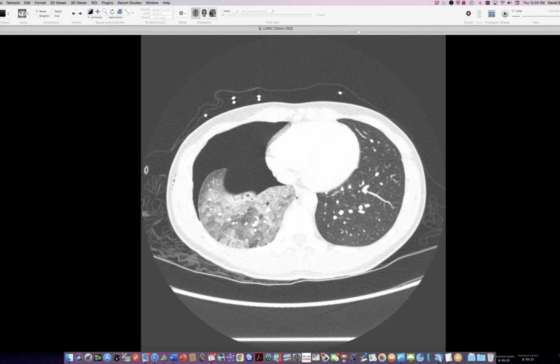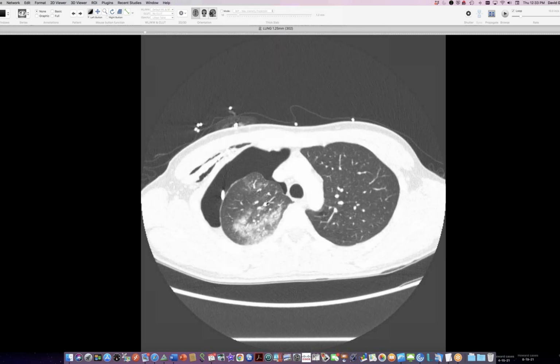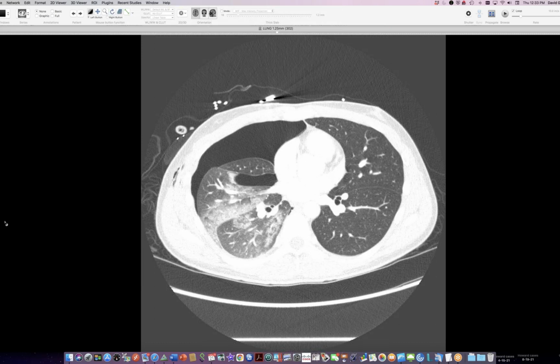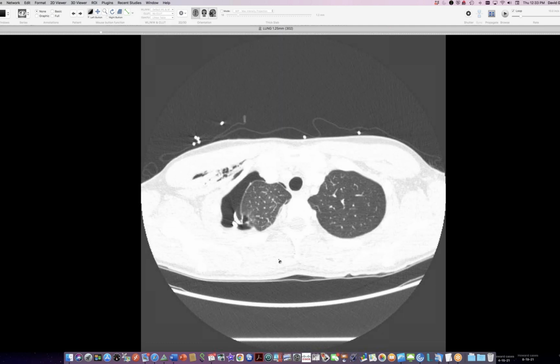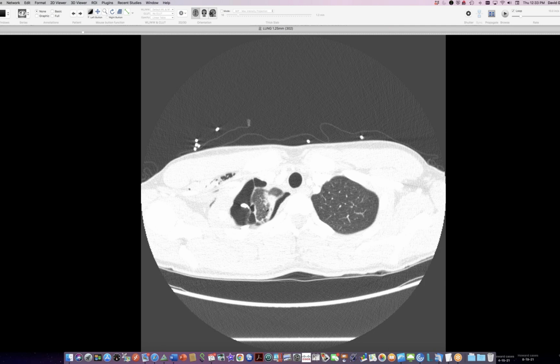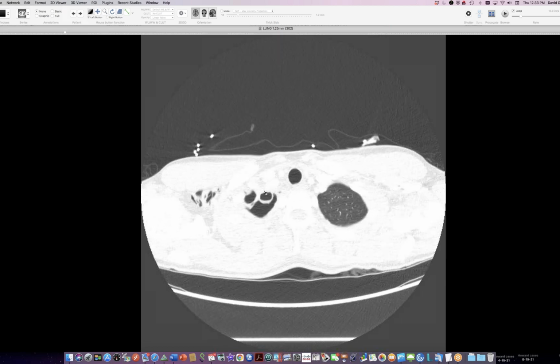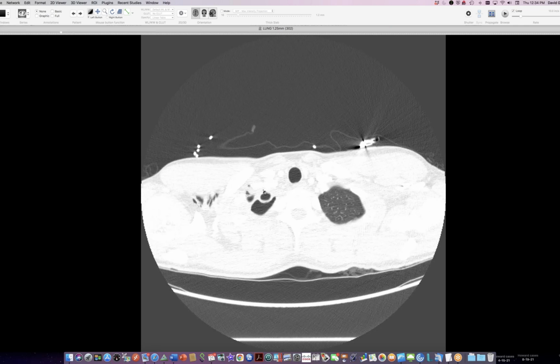So it's one of the few times I've managed to see a CT scan in the setting of re-expansion lung edema. So he's doing better now. And I think the CT also shows, as we get toward the apex, what the source of his pneumothorax was. He does have some apical blebs. You can see some of these are right on the edge. And there's some adhesions here in this right lung apex. And we even have a bulla out here in an adhesion, probably. So one of these things popped on the surface of the lung, led to his pneumothorax.